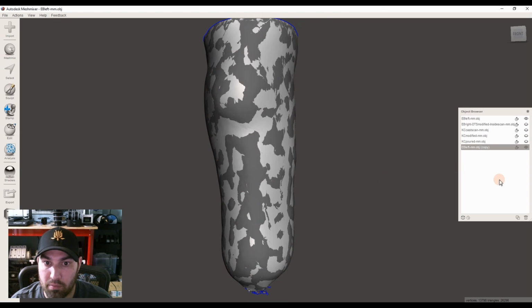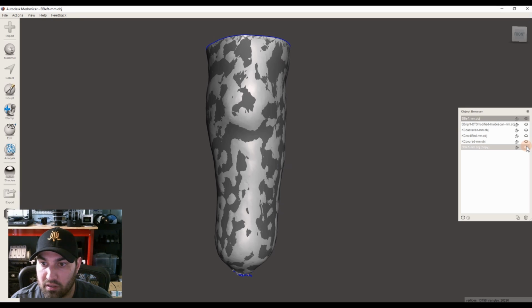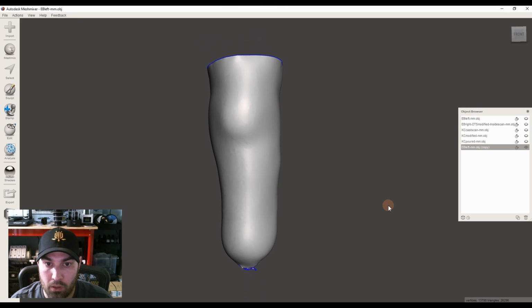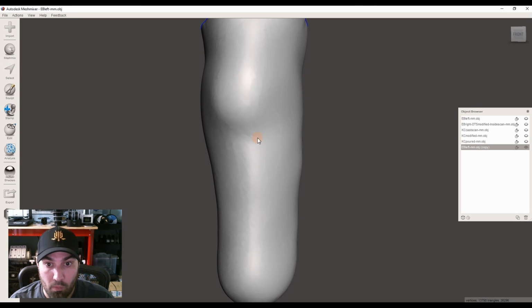And hit escape. And then we can turn off that model. And you can actually click back and forth and see the difference in the smoothness of those. So that covers general smoothing. You can do that at any time. You can do the whole model.